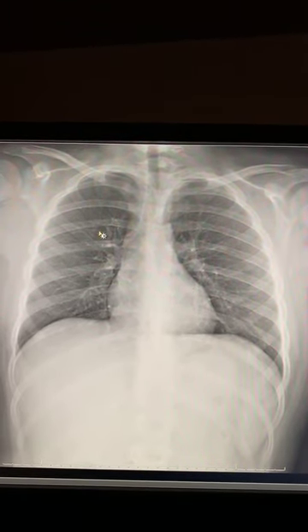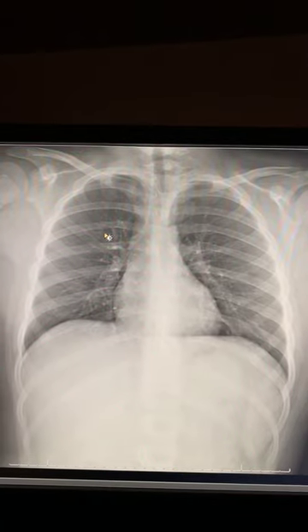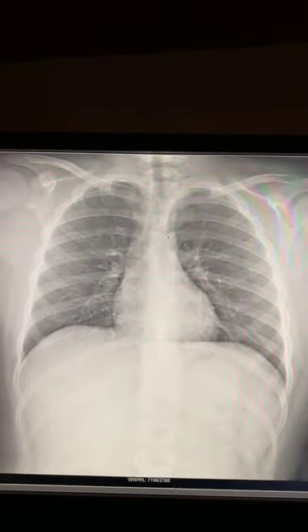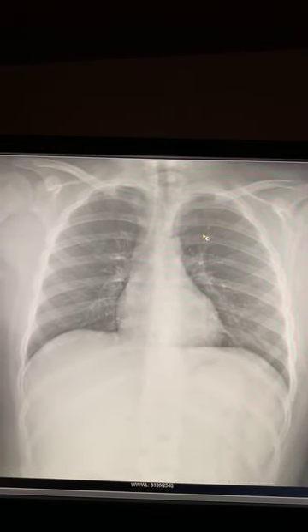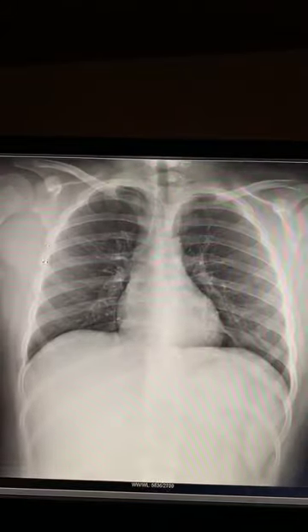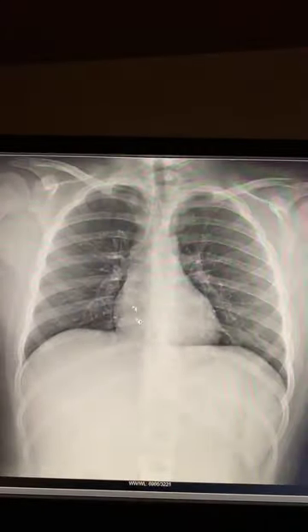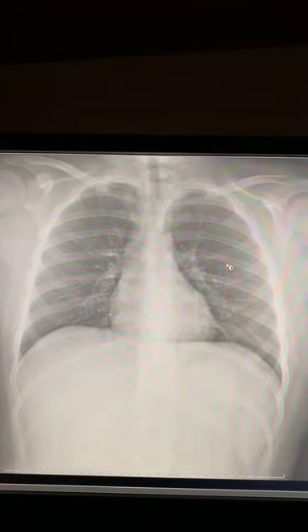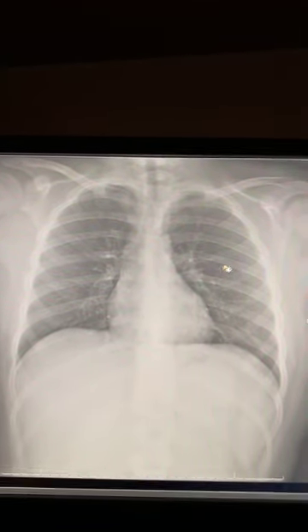So, the big thing that everybody loves talking about and everybody loves looking for is that pneumothorax, all right? If you're looking for a pneumothorax, once again, you know my view on windowing. So first of all, you better be windowing. Your mouse should be doing this at all times when you're looking at a chest X-ray. If you're just looking at it like this and interpreting something, I'm sorry, you're gonna be missing stuff.